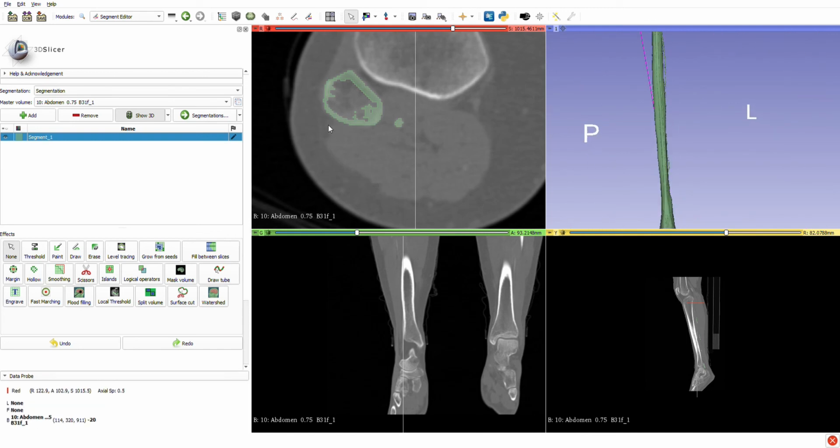And the next step is to save and export the STL file, but as I said, because of the GDPR, I won't record this part, where the proper ID of the patient will be visible.